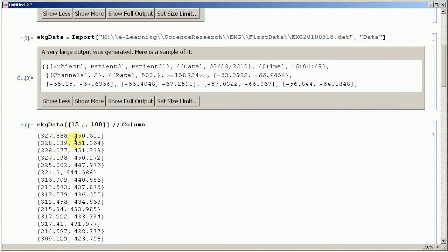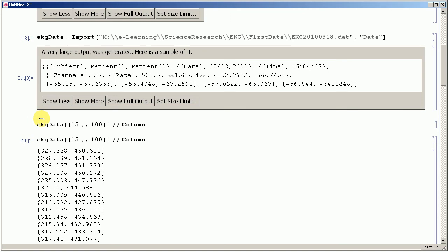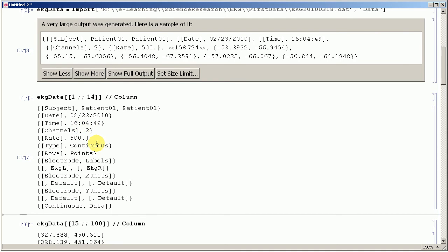So of course, the data that I skipped here, the data that was going from 1 through 14, they're very important. That's what allows you to set certain parameters to see how to read this, when it was, and how many channels it has. Right there, this is stereo. Now that explains this, you see. This is not time versus the voltage. This is, both are voltages. Then you may say, then how do you know what time it was? I told you. It's 500 times per second.